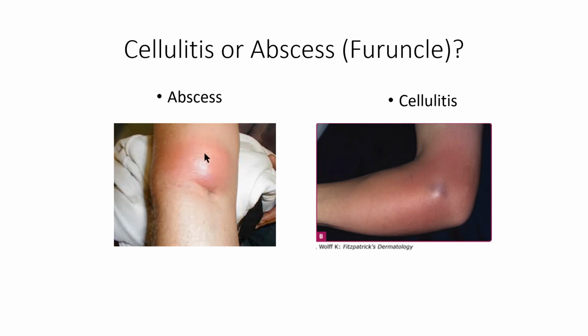So it begs the question, cellulitis or abscess? Well, if it's on your arm, I might say something like, well, let's just numb it up and stab it with a scalpel and see if any pus comes out. And that would be fine, and that's done frequently. However, if it's my arm, I'm going to say something like, well, why don't we put an ultrasound probe on there and see if there is an abscess?